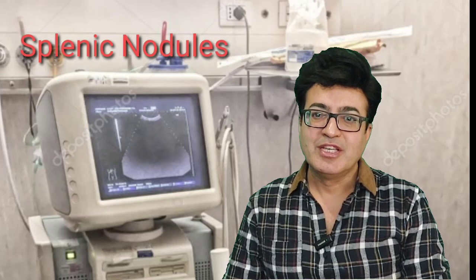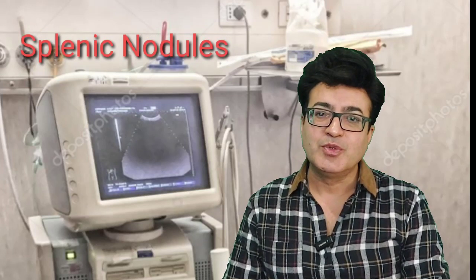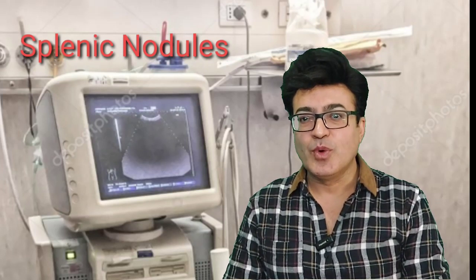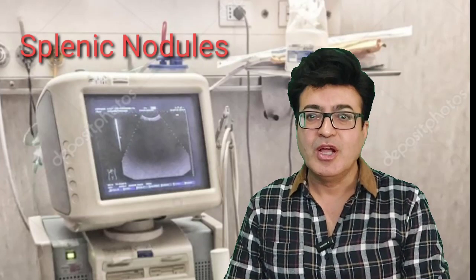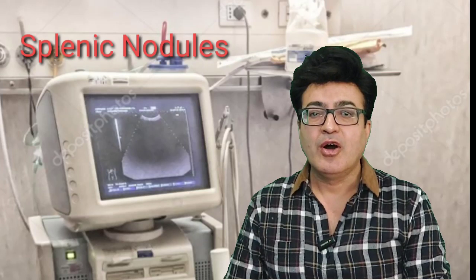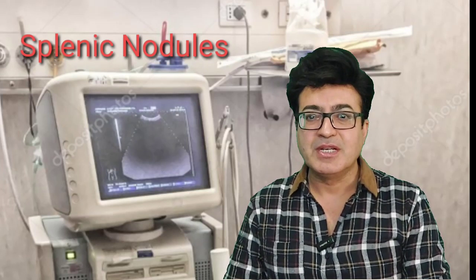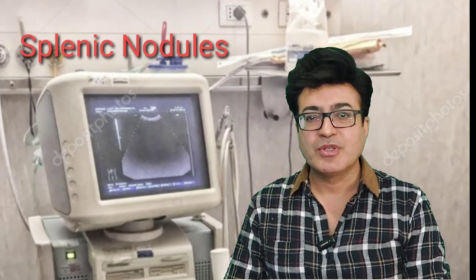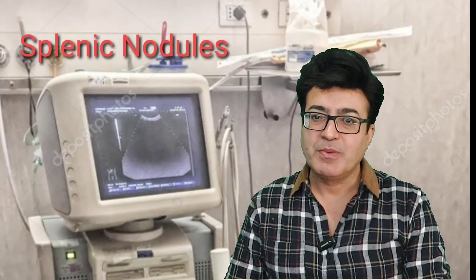Today my topic of discussion is splenic nodules. Splenic nodules are variable. They are subdivided into micronodules and nodules. If the nodular size is 1 to 3 centimeter, that would be considered a real nodule, or splenic nodule. If the size of the splenic nodule is less than 1 centimeter, then it would be considered a micronodule. So sometimes you will come across micronodules, and sometimes you will see a nodular pattern within the splenic parenchyma.